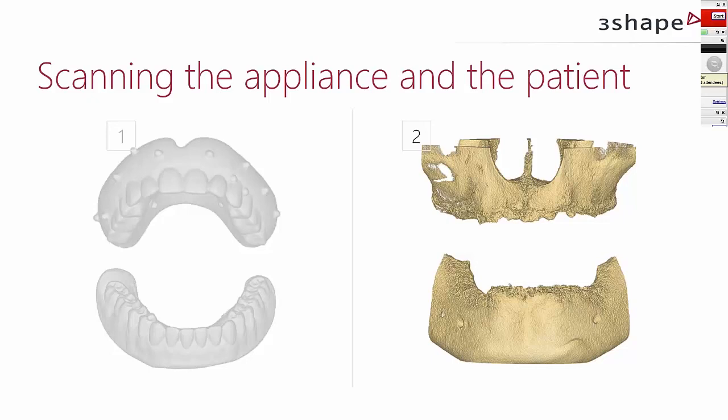So actually, thank you very much, Thomas. So there's a lot of information. Maybe just to summarize it, when doing the CT scanning, first always start with the denture scan. Make sure it sits in the right spot, in the right position, on a stable platform, either by the original device delivered by the CT manufacturer, or use Styrofoam. If you use Styrofoam, make sure it sits stable. After scanning the denture, make sure the image quality looks good. You can see all the things you need to see, including the whole denture and the markers. Then you move on to the patient.